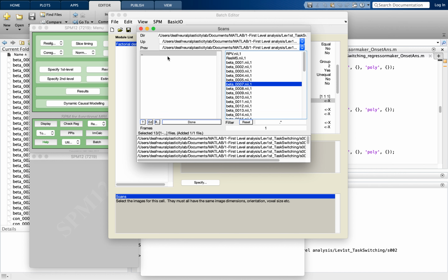So finishing this up, I have a few participants. If you go here, you can check what you have included, and you can also check that there is not a file that should not be here.